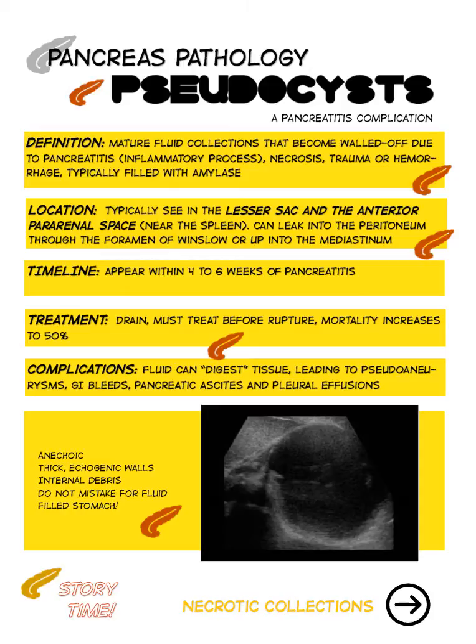And it does definitely look a lot like a fluid-filled stomach. And the more that you see stomachs with liquid in them, you'll kind of understand what those look like and how the stomach swirls all that around. So you'll be able to tell them apart, but it does look very similar. But the little girl also had some thrombus in her portosplenic confluence. And so that was interesting to see as well. But we really were just monitoring her every day, seeing how this pseudocyst was changing.